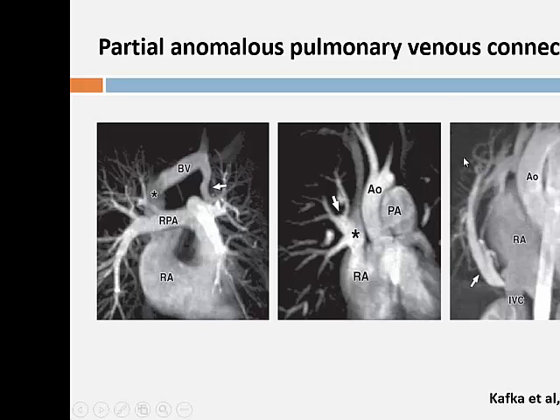Yeah. So all the venous drainage of the upper and the lower lobes goes via this big collateral vessel, which then joins into the IVC. Yeah. So the point is they all have to make their way back into the right heart, and they do that by the quickest route. So remember, brachiocephalic, SVC, IVC, coronary sinus.